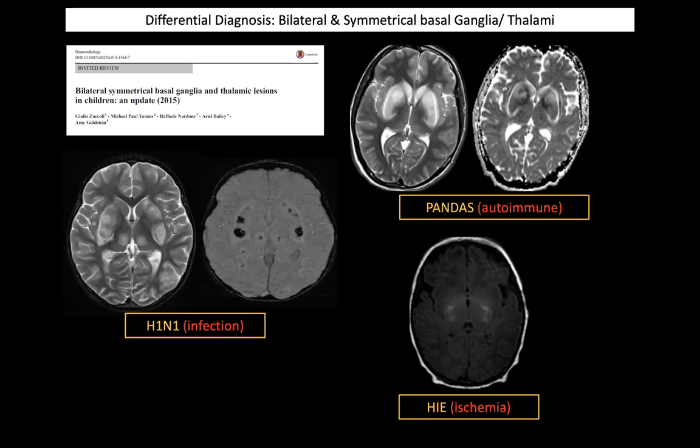Of course, hypoxic ischemic injury in a neonate: these are very sensitive areas because of the high metabolism, so they can have bilateral and symmetrical involvement of the basal ganglia and thalami. Normally, you have posterior putamina and ventrolateral thalamus involved, with sometimes the perirolandic region also involved, and the typical perinatal history.